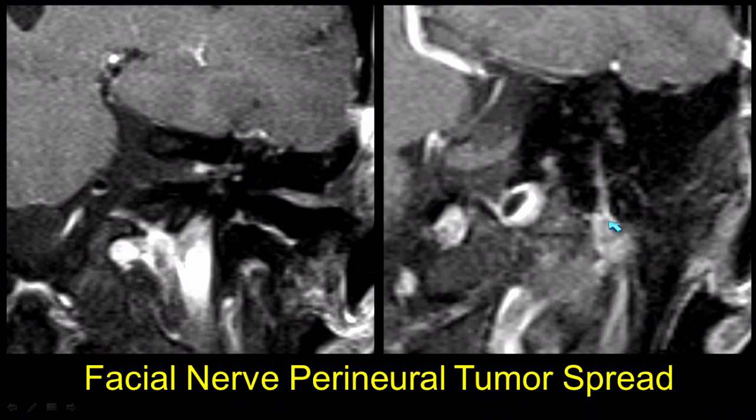Here's another case where we had a similar lesion within the parotid going up the descending mastoid segment, and this one was going all along the tympanic labyrinthine segment and enhancing within the lateral IAC itself.